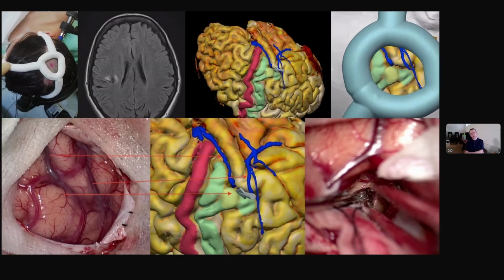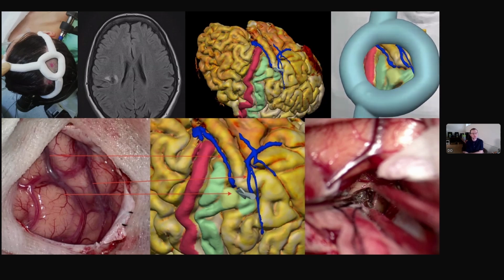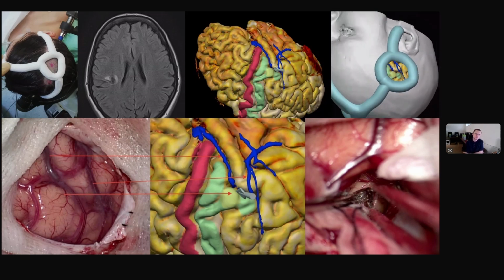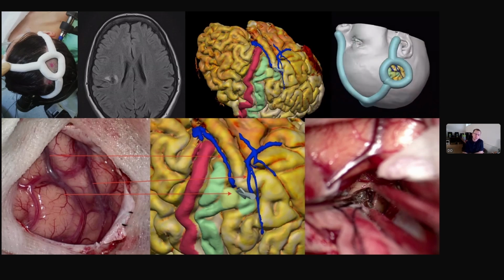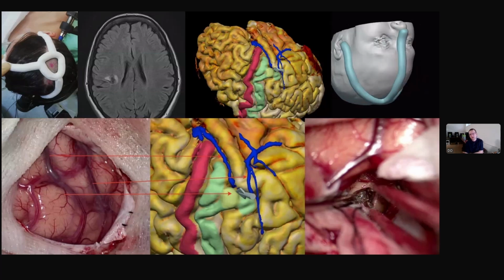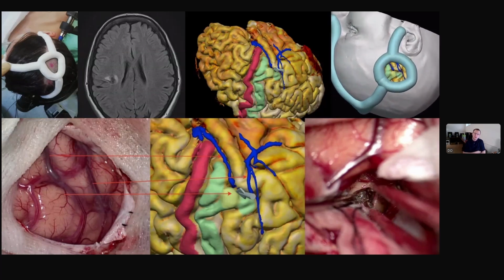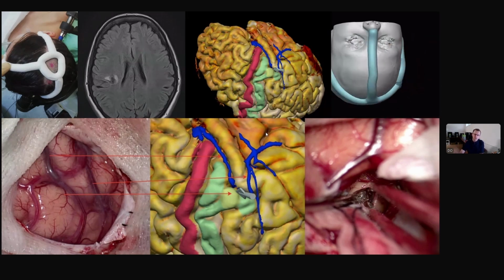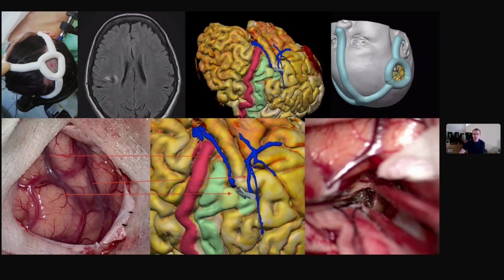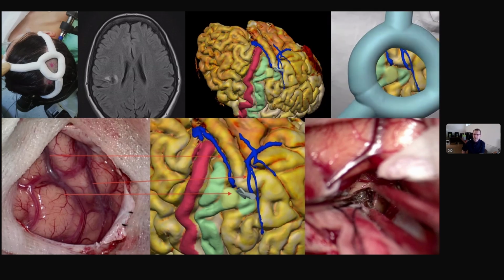We can use segmentations for printing such individual craniometric rulers. And we even wrote an article about this topic. It is freely accessible. We can share the link in the chat. I think this is very helpful too. This is about our FDM and SLA printing techniques.